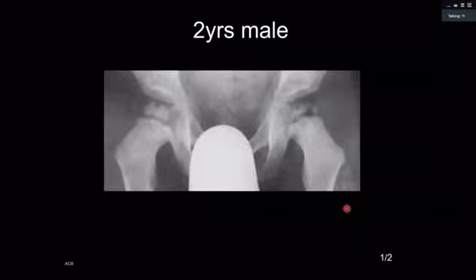So this is a frontal pelvic radiograph for a 2-year-old male. The bilateral femoral epiphyses appear slightly stippled in appearance, with irregular margins and some loss of height on the left. There's also possibly an associated effusion on the left-hand side. No other abnormality is seen. My primary differential for these appearances would be avascular necrosis.